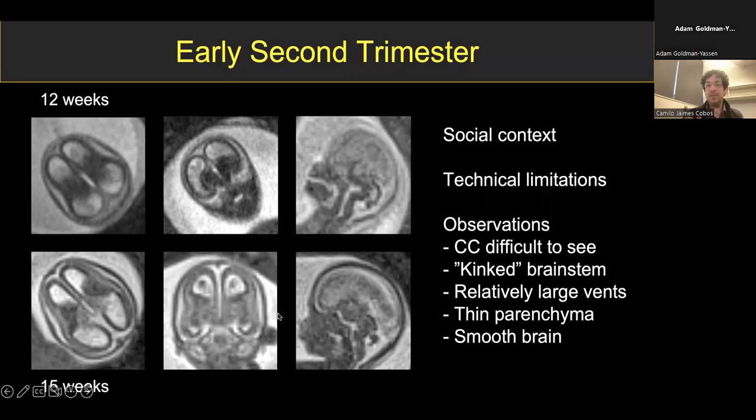I think by 17 weeks, you should definitely see a corpus callosum. In most 16-weekers, you should. In most 15-weekers, I didn't. But you know, there's tons of fetal imagers here that are far more experienced and have sharper eyes.